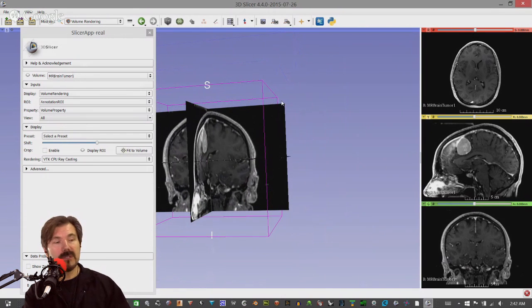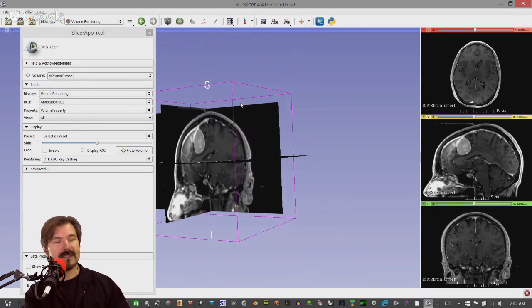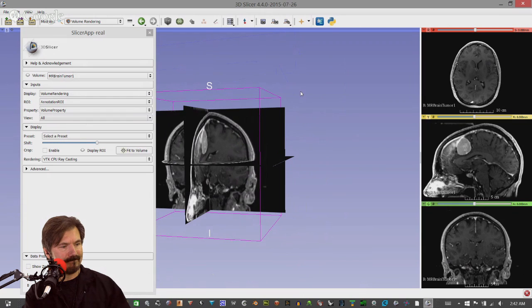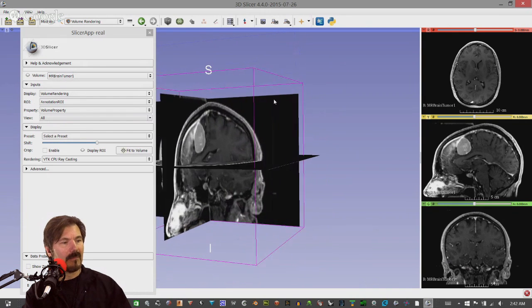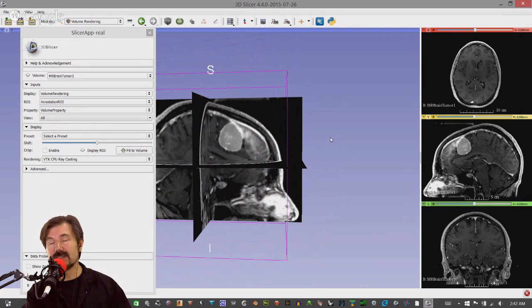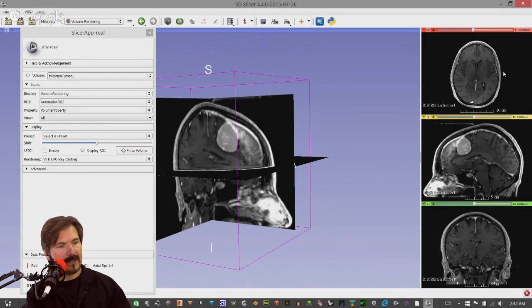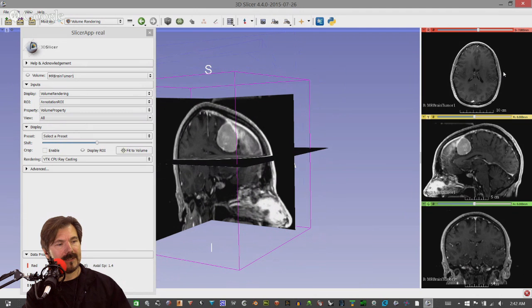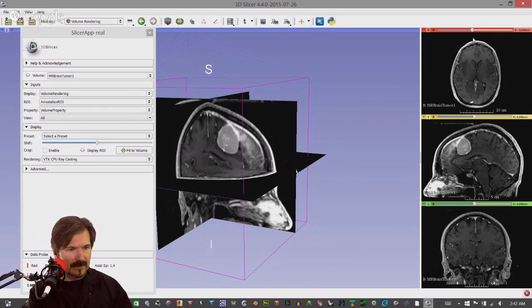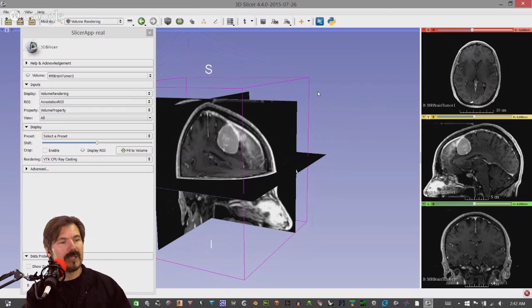But these are all still two-dimensional views, like cards placed in their proper three-dimensional space. And you're probably already familiar with this, correct, Javin? Yeah, a little bit. But what's cool about this is that it allows you to see how this would look in three-dimensional space. And you can literally move the slices, as you can see here, wherever you want, and then you can rotate. Another strength, let's see if I have to turn it on here. Well, we'll do it later on. You can do what they call ROIs and look at them in 3 dimensions, and we'll play with that.